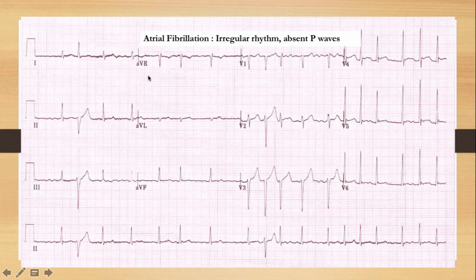So let's look at the P wave. So you can see that there are some upward and downward deflections everywhere. So especially, for example, in this lead, this is T wave. One might say that this is a P wave or this is a P wave, but this is not a normal P wave. You can see there is notching. The P wave is not followed by any QRS, and also there is no regular normal morphology of P wave. So that is why we will call it atrial fibrillation, because it's so irregular and the P waves are virtually absent.